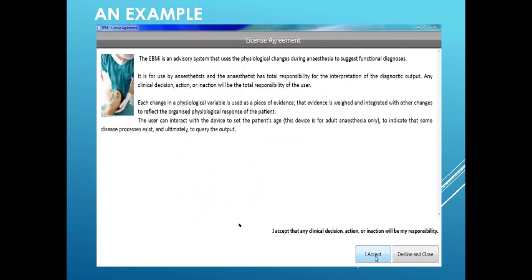Here we have an example of the software in action. This is an offline video. It uses a previously saved file. It also goes very fast because you would not wish to sit through the process in real time. The alerts may seem to be rapid, but that is the nature of the speed of the replay.